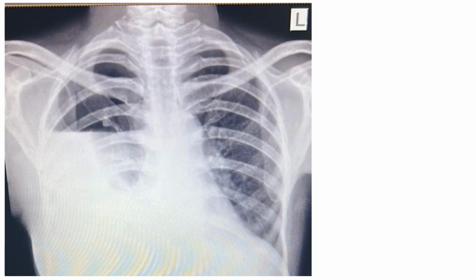As you see more and more x-rays, you tend to get that visual memory, and after some time, as soon as you see the x-ray, you identify these things. That is the reason why I'm putting up several x-rays, so that as soon as you see it, you know that this is hydropneumothorax. This is something that should not be missed.